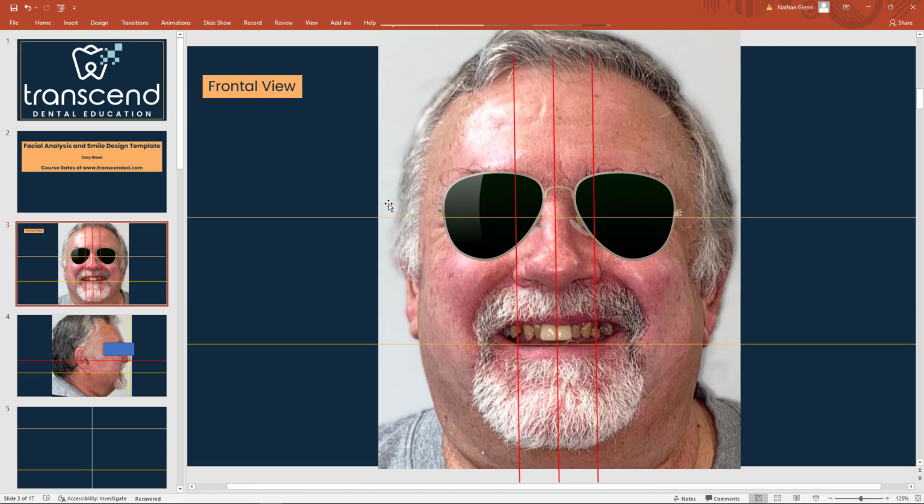So all I've done so far is pull this into the template, and this template is something I've made free and available. If you go to that Easy and Free Smile Simulation video on YouTube, in the comments there's a link that you can click that will take you to where you can download it. I don't make anything off this, it's just something I found useful.